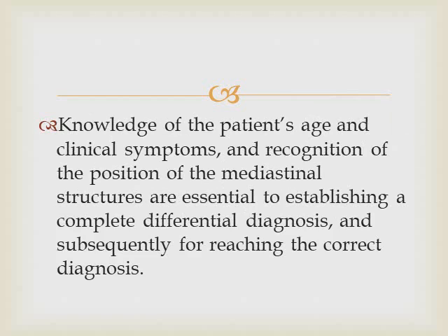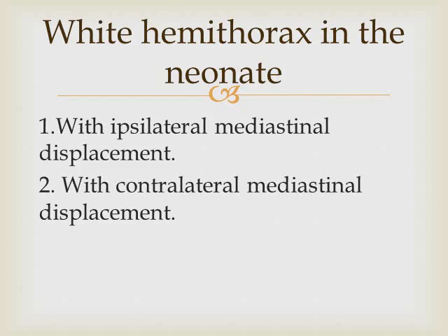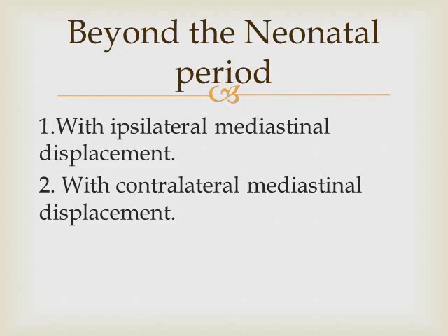So knowledge of the patient's age and clinical symptoms and recognition of the position of the mediastinal structures are essential to establish a complete differential diagnosis and subsequently for reaching the correct diagnosis. For educational purposes, the white hemithorax has been divided into two groups according to the age and position of the mediastinum. White hemithorax in the neonate with ipsilateral mediastinal displacement and with contralateral mediastinal displacement, and white hemithorax beyond the neonatal period with ipsilateral mediastinal displacement and with contralateral mediastinal displacement.